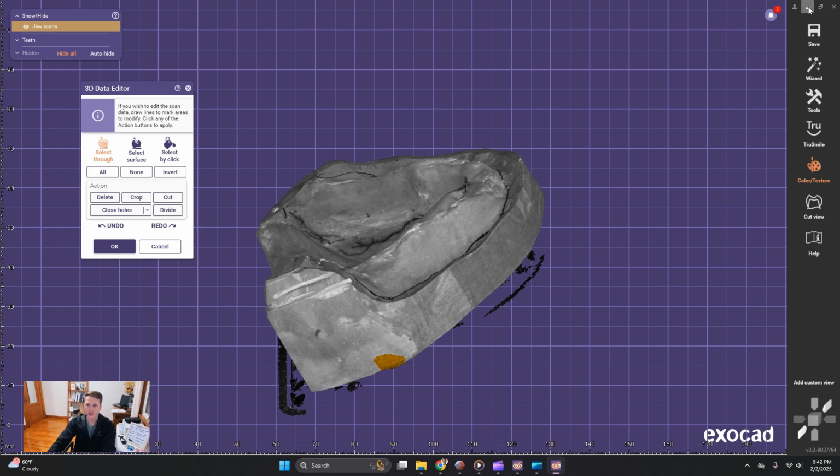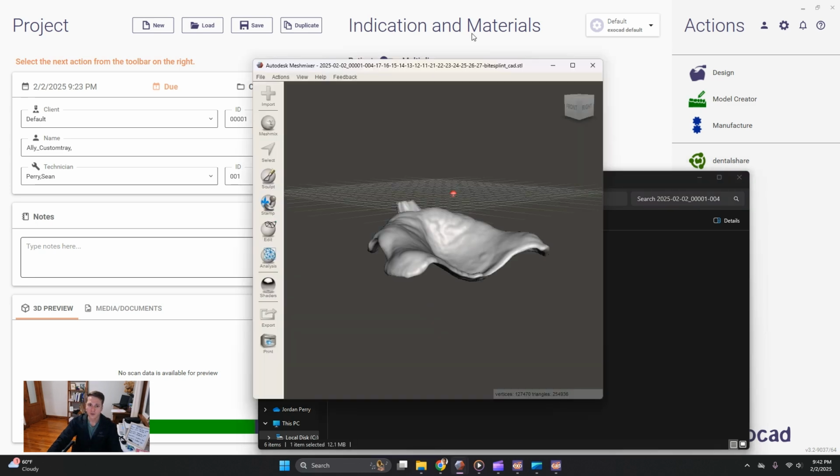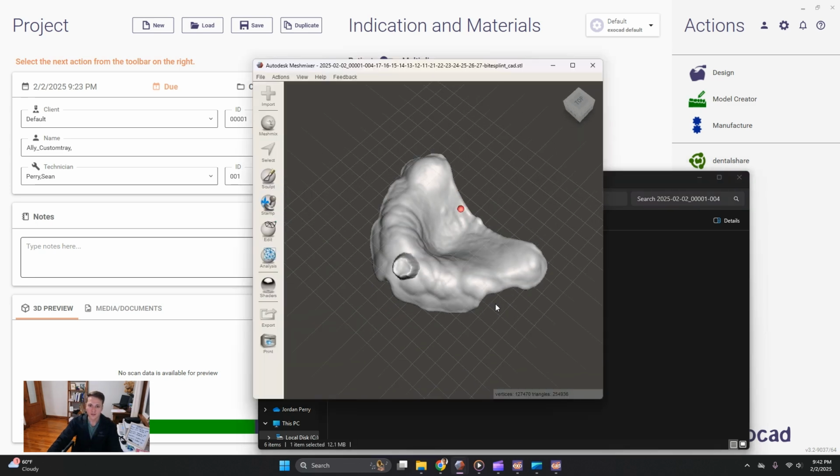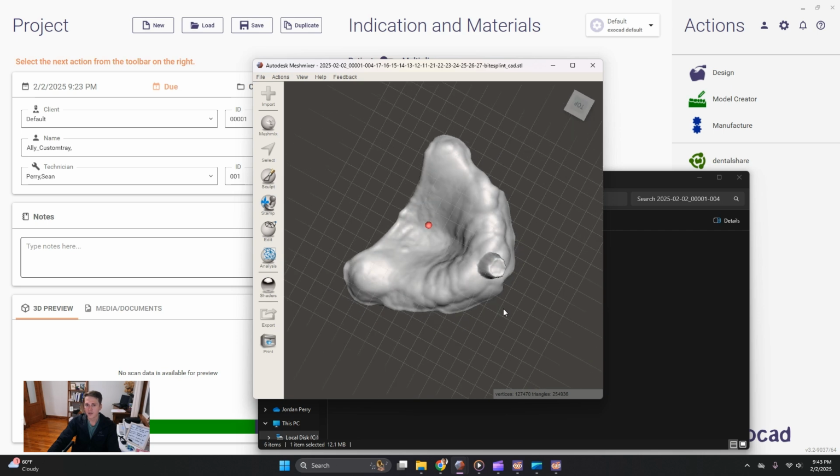And then when you're done here, you go back and you hit open Explorer. Here is our maxillary tray that we had made. You can see that we have it. I took away the tissue stops from before, but we would have had our tissue stops. There's our little handle, and this is ready to send to the Rayware software to get nested to go on the printer.